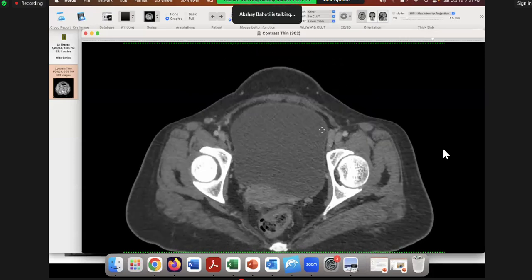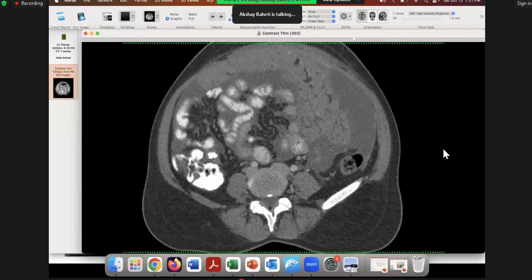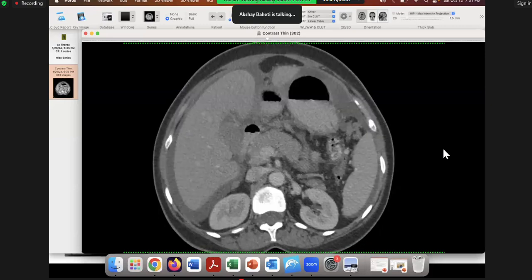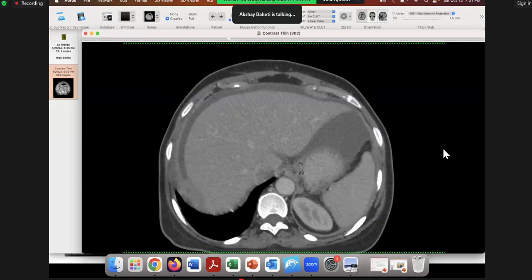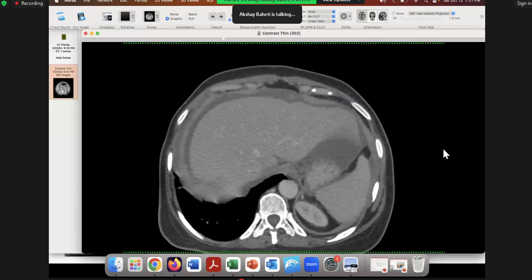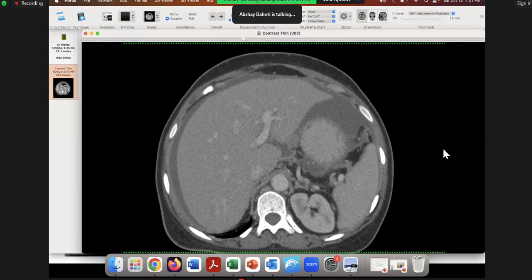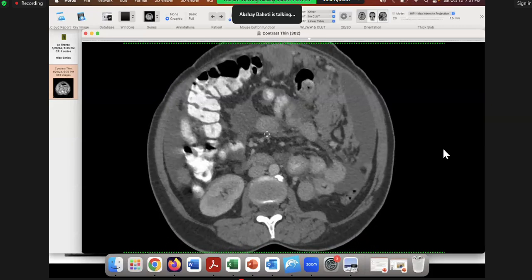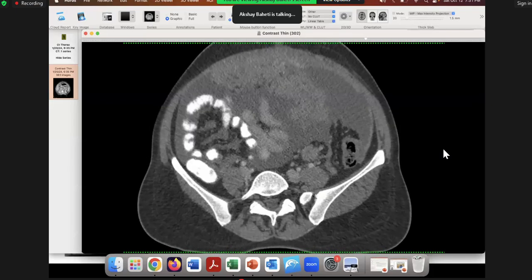All right. But so what you need to search, just to reiterate, first thing is going to be root of mesentery. You're going to look at the hepatic hilum. You're going to look at the lesser sac. Okay, look at the subdiaphragmatic region because it's very thick in the subdiaphragmatic region. It's not easy for them to get till there. So this again becomes sometimes difficult. Okay, so these are places you specifically look for. All right, because it makes it difficult, and the entire mesentery per se. All right, omentum, don't worry. Omentum they will take care of. Peritoneum they will strip everything out.